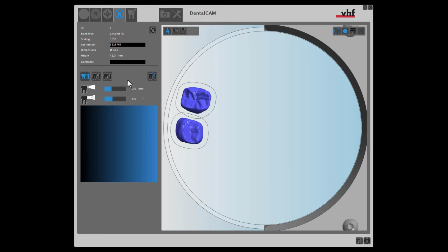With the left mouse button you can set a bar at the desired position. While keeping the left mouse button pressed, you can move the bar horizontally around the object. The preview window helps us to find a suitable position.